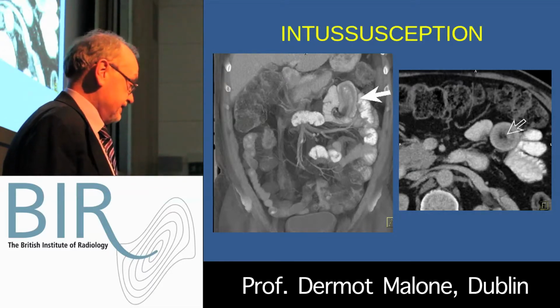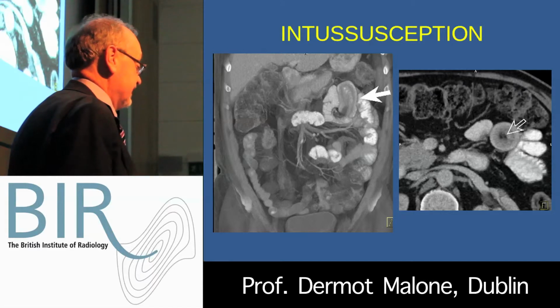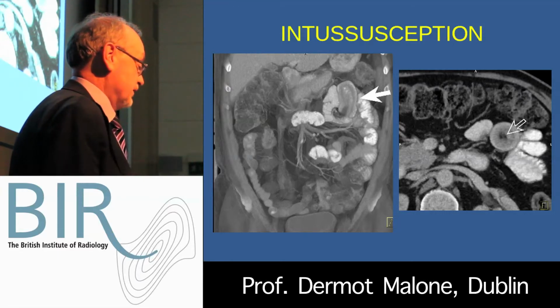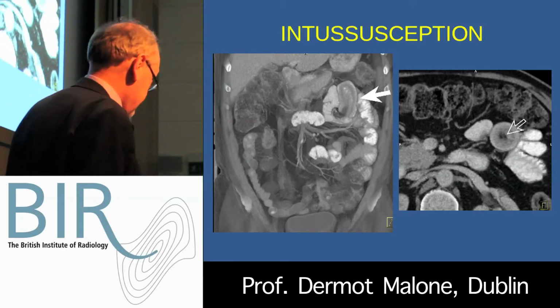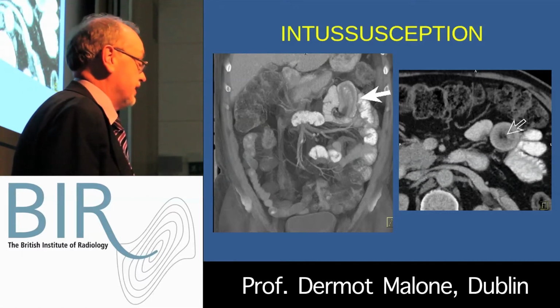Intussusception is really well seen by CT, which has a characteristic appearance. Intussusception, as you know, is like the closing of a telescope, with the lead point forming the intussusceptum and going into the intussuscipiens. We see the multi-layered target with fat of the mesentery at the center, and oblique coronal planes show the abnormality very convincingly.